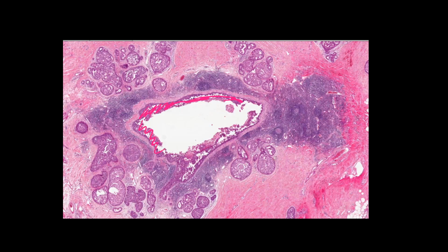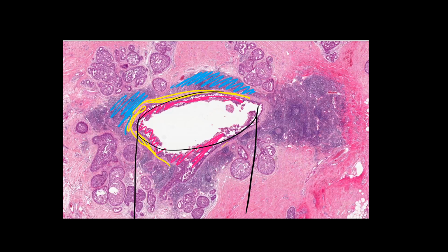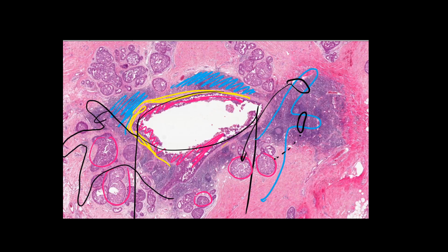This is not just a simple additional cross-section of a duct-like structure, but you see those circular cross-sections of cancer-filled ducts around it. Some pathologists may call them multifocality. Now, they are not. If I was drawing the longitudinal section of this duct, or duct-like structure, then imagine, by thinking in 3D, that this duct had neoduct genesis-like side branches on both sides. And when the histopathology technology slices using 4 micron, then you get a ring, which corresponds to the so-called multifocality, and another ring, and also on the other side. No, this is not multifocality.